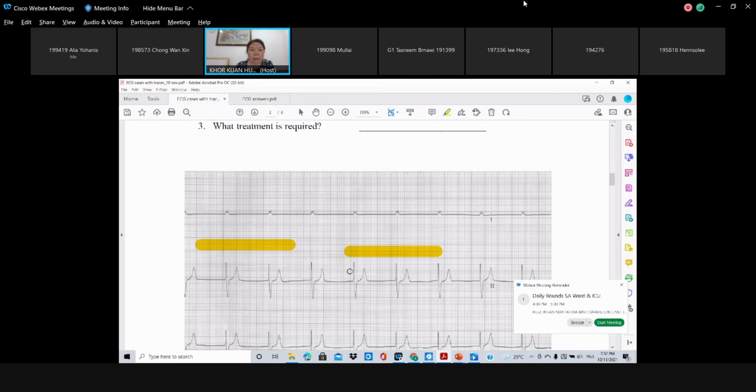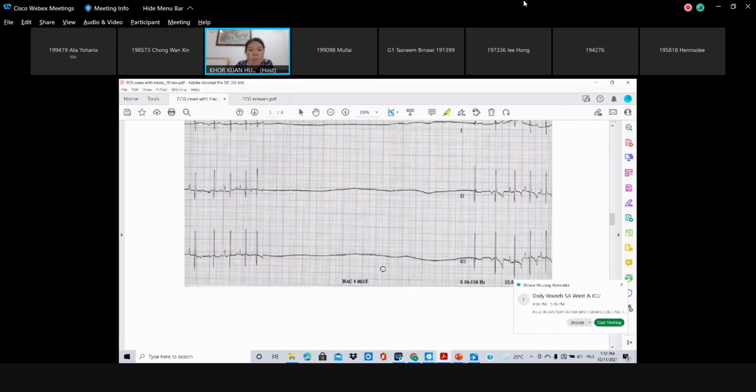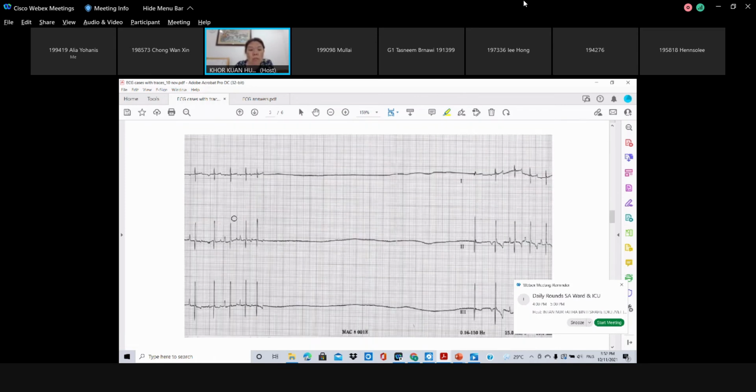Sometimes if they are having an arrhythmia, a rhythm issue, normally we won't be able to calculate the heart rate. The heart rate might go beyond 200 because the calculation is incorrect. For example, in this kind of case, if here got nothing, then there's no heart rate.